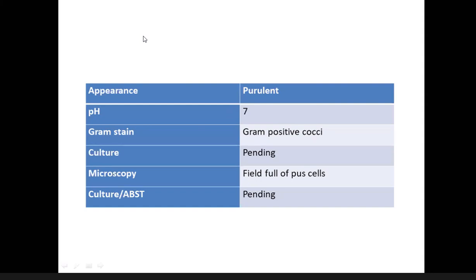Any other questions? Could I know the reason for the upper zone opacification in the first X-ray? Right, upper zone opacification, just ignore that. This is a chest X-ray which I downloaded from the internet. I just wanted to show you the pleural effusion. Ignore the right apical area. Just to create the scenario, I downloaded the chest X-ray.